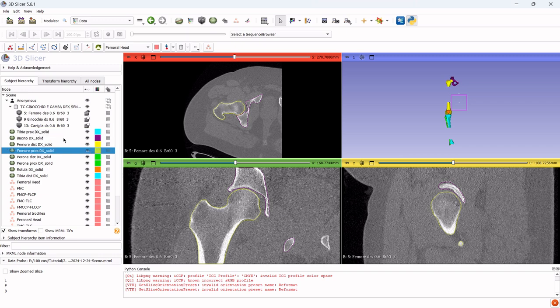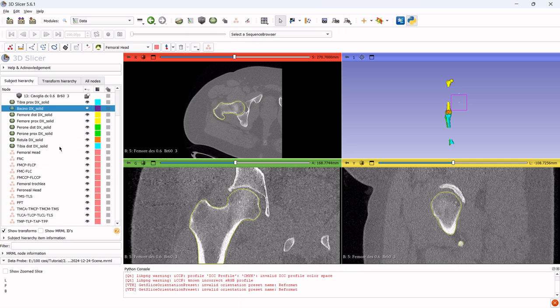It may happen that the hip is missing in the 3D view, but you can still find it among the models. This is a trick to keep the format identical for all the files. The hip is not really important and could have been omitted. In fact, we hide it immediately by clicking on the eye icon next to it. Further down, we have the landmarks, which are still empty.